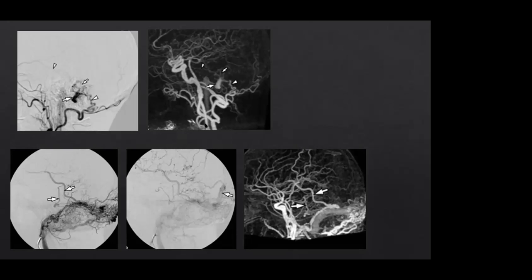But more importantly, apart from identifying the site of the fistula, is to recognize the venous hypertension, which then changes this fistula into a dangerous fistula, i.e., there is venous hypertension, there is high pressure within this vein of Labbé, which is draining the inferior aspect of the temporal lobe, and you can see the venous congestion and what we call the pseudophlebitic appearance because of venous congestion, exposing this patient to a very high risk of venous hemorrhage. And this was just to show you how anatomy can be used to understand the hemodynamics of the fistula.